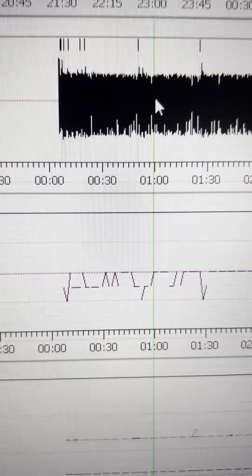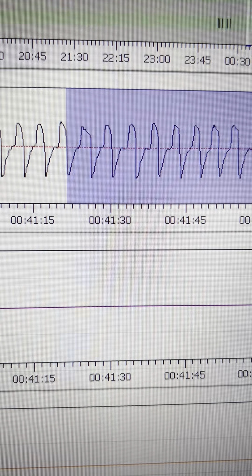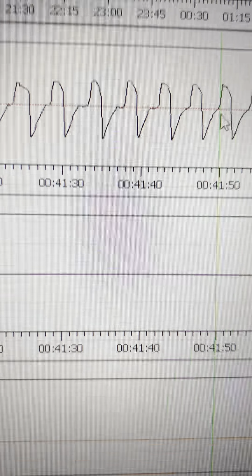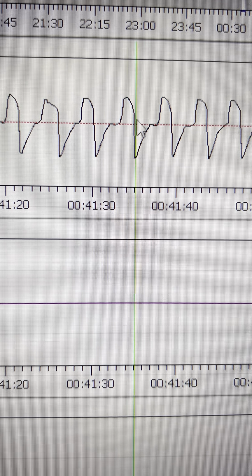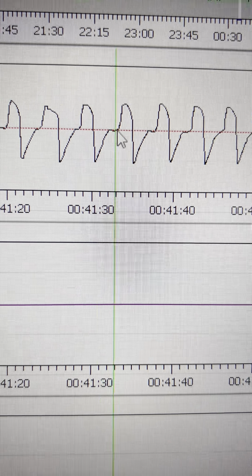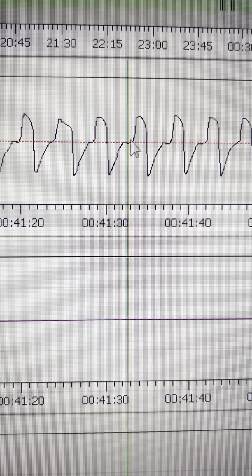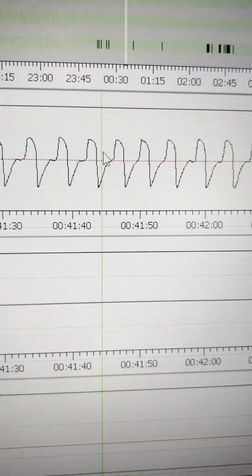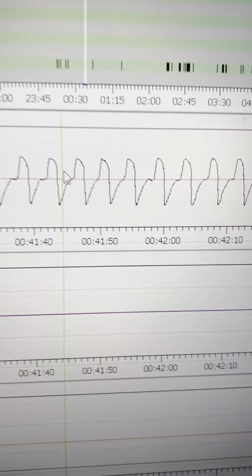So right here, if I go, you can also see that right here, they're more underventilated. Why? Because they have these things right here. I'm still breathing enough, but I mean, here's some flow limits, but you can see these small parts here where I'm not breathing, and they're extending basically the respiratory rate, so it goes down.